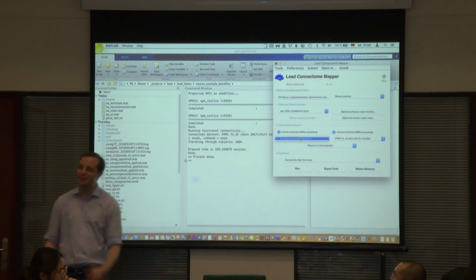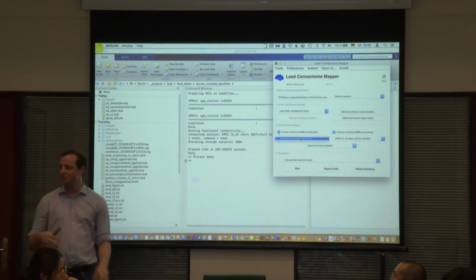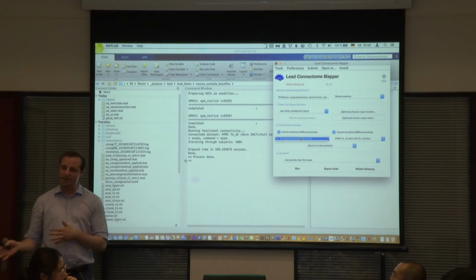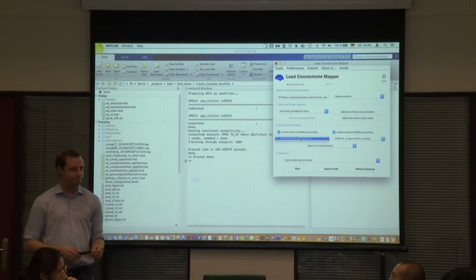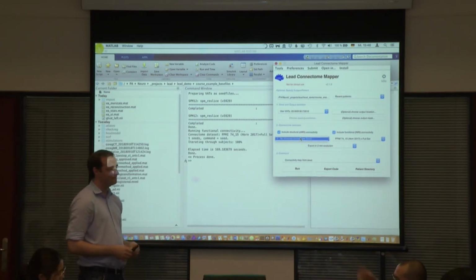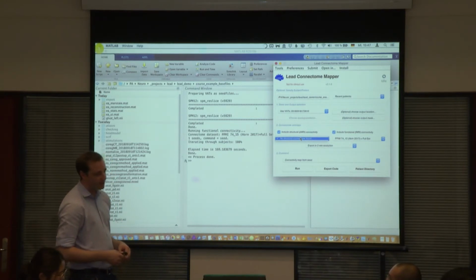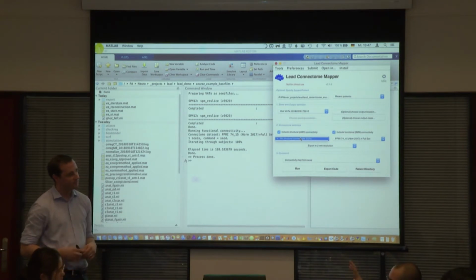So Lead-Mapper always gives you Nifty files, not streamlines. So you can use them in software like SPM or so to do stats, but if you want to show tracks, then the visualization mode is better. Yeah. How to show it? To show what? Any Nifty viewer. Yeah, but it's only in the file, so I need to synchronize with the program.